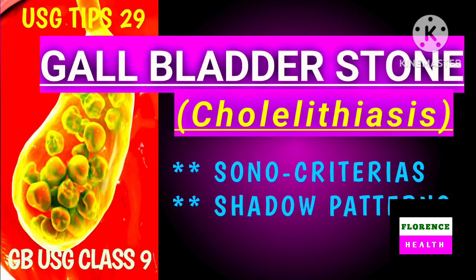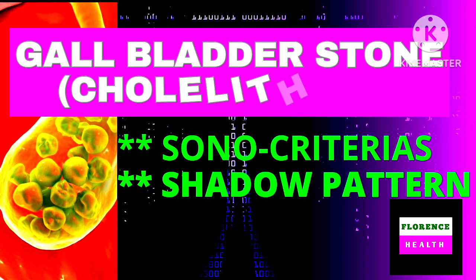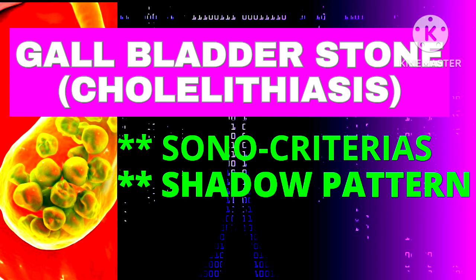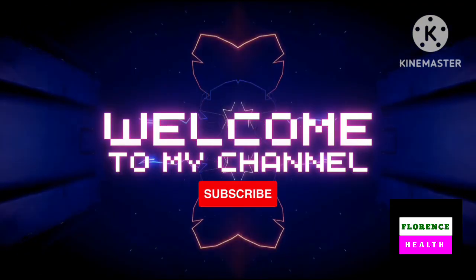Friends, today we will discuss a most interesting topic in the surgical field, that is cholelithiasis. This is a common condition which you generally come across in outdoor practice. Let's discuss how you will recognize this condition on ultrasound. What are its sono-criteria and what are its shadow patterns?